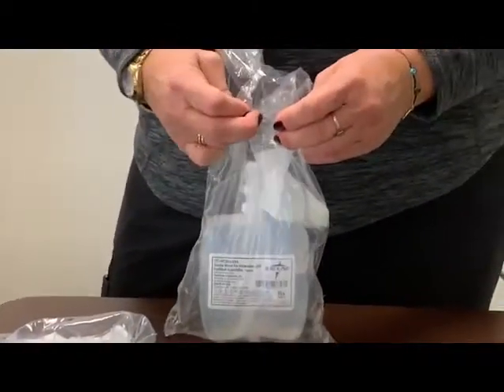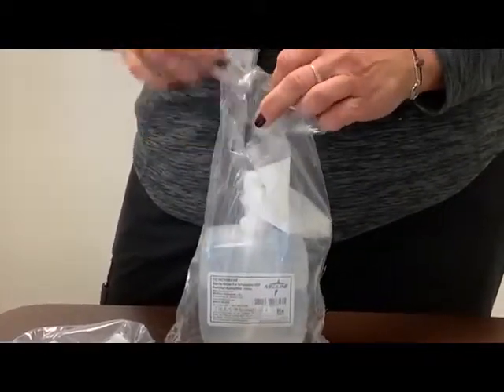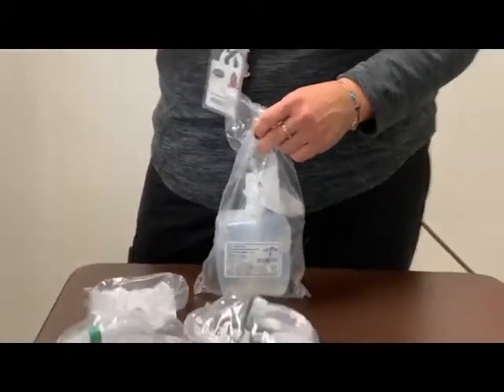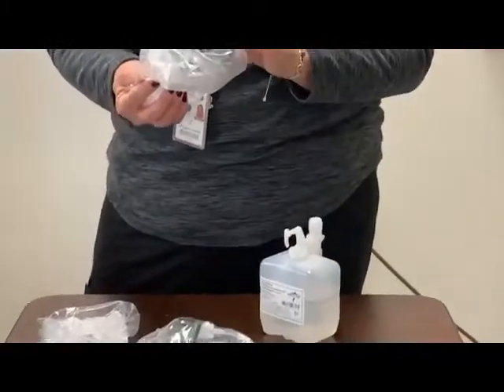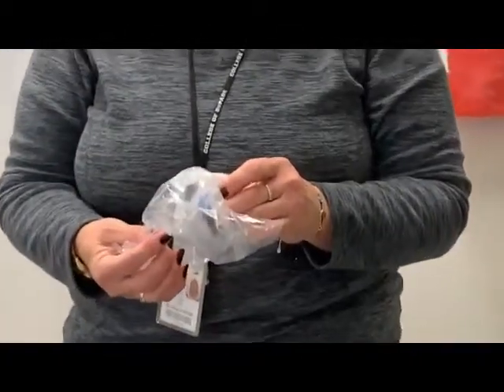This bubbler that I had mentioned in the beginning is actually designed to add a little bit of relative humidity to the gas that the patient's breathing in. If your patient is telling you that it's very drying, that they're getting nosebleeds, or they're having problems, it's red and irritated, you're going to want to add some humidity to them. Most hospital policies will tell you to go ahead and add humidity at about 3 or 4 liters per minute, or it would be per patient request.